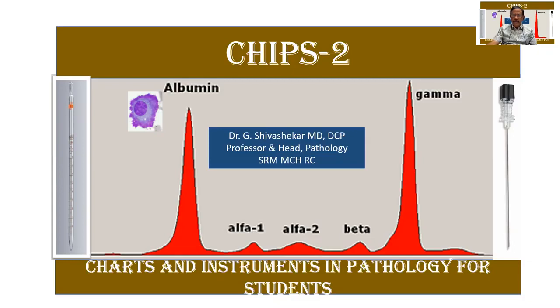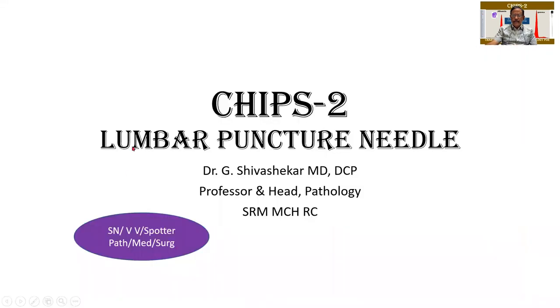I hope from the screen you will be able to make out what I am going to talk about. Yes, it's a lumbar puncture needle. The importance is given over here and it can be asked in any of the clinical subjects as well as in pathology. As mentioned earlier, this can be part of the theory as well as the Viva. CSF is an important question for you people, for which this shall be forming part of the answer.